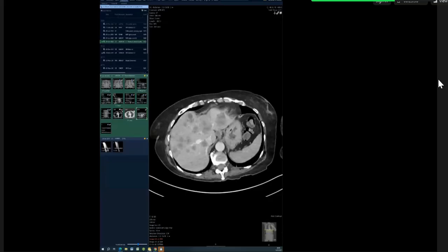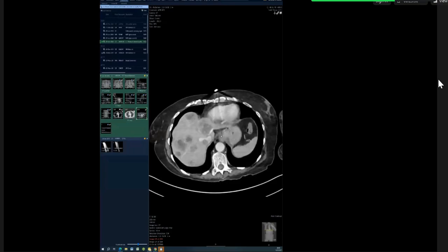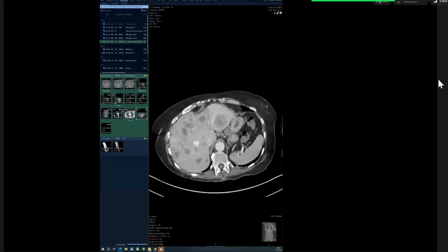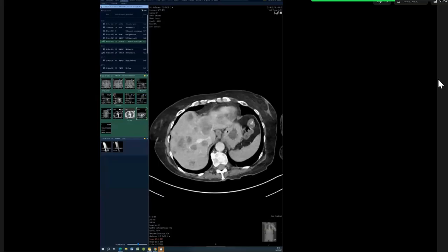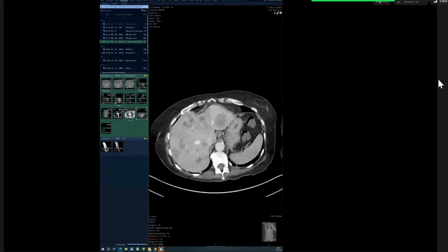You picked the liver lesion. You did not talk about the necrotic looking nodes right next to it, and that's one. That's two. And you picked the stomach wall thickening. The minute you picked it, you should have noted that there were nodes next to it. And this patient actually did have an esophageal primary with adjacent lymphadenopathy and the liver mets.